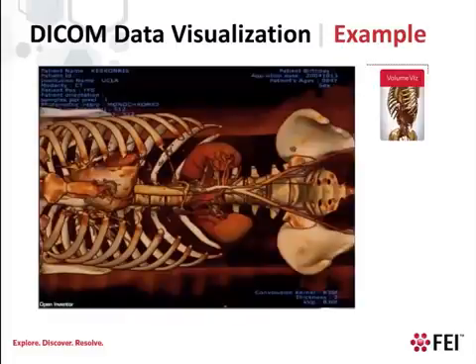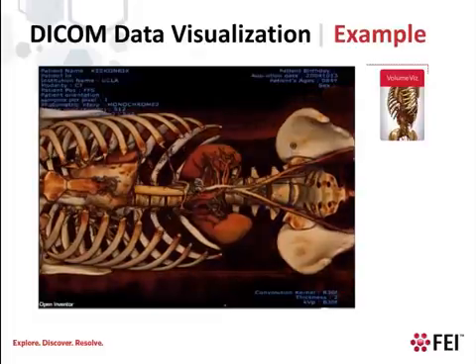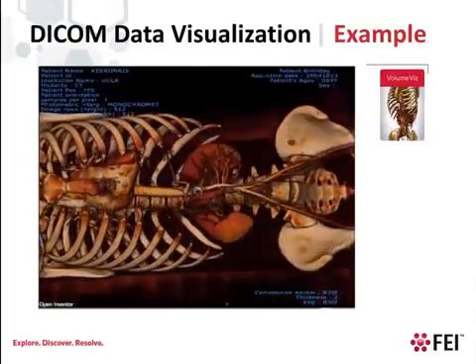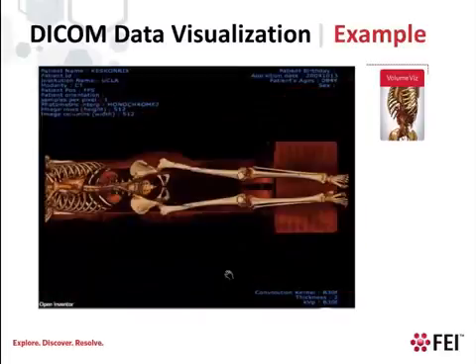Let's go into the volume rendering options and enable ambient occlusion. This is an approximation of global illumination in the scene and can be very helpful to visually differentiate the various structures in the volume. I'll switch back to the rendering window so you can see the effect. This is just one of the many image enhancement effects available in Volume Viz, including edge enhancement, 2D edge detection, and boundary opacity enhancement.